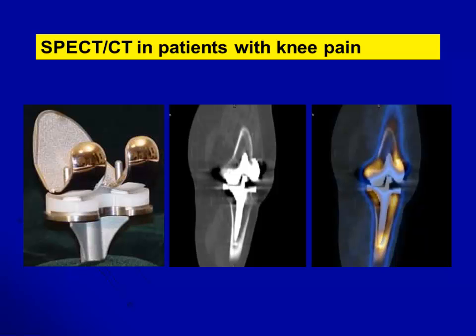And what he said is exactly correct. Patellofemoral is the most common, and you need to look at it as critically as possible, because we normally look at the planar images, we look at the patella, we ignore it, because in the back of our mind we say, oh, this is very common, so we don't need to mention it.